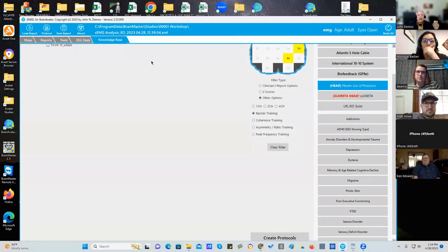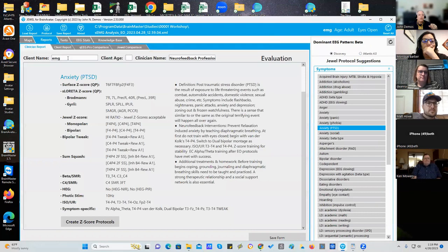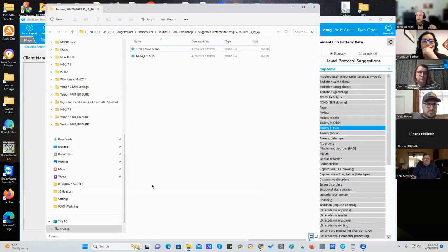But now that can be scary to do all this for some new users. And so consequently, I don't want to scare anybody. So what we're going to do is when we go to reports, we go to the clinician report. If you're saying, I don't know what to do, I'm just getting started, okay, there you go. You're started. It tells you what to do.